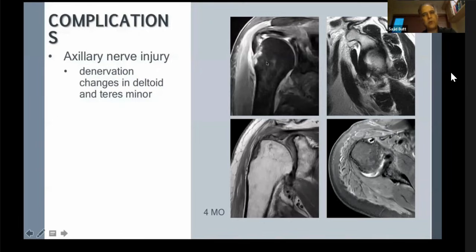So they love this sort of a scenario. We can see a few findings, but then the clever students amongst you will be able to put everything together and see exactly what's happening. Hill-Sachs lesion, everybody should be able to pick that up. Rotator cuff tear, I would expect you to pick that up.